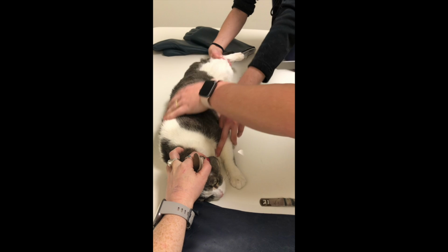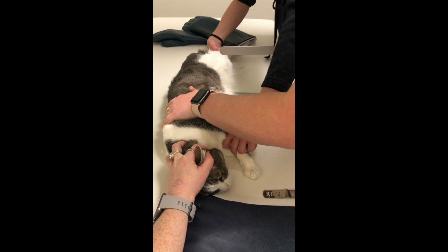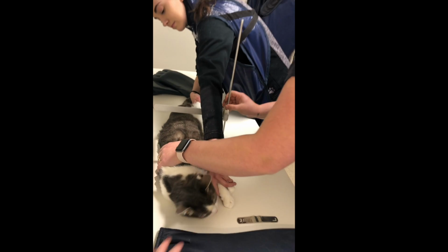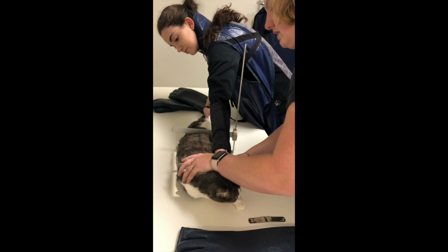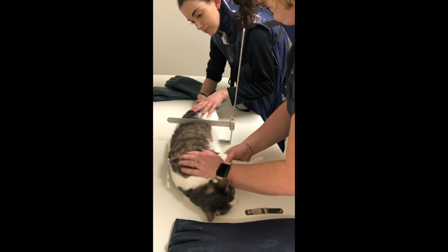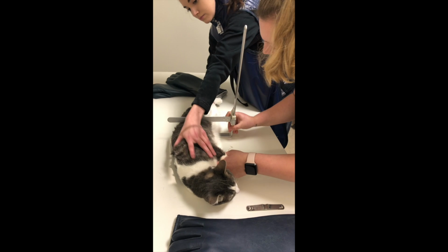This will give you the best measurements for evaluating the specific structures needed. Patient preparation varies depending upon the special procedure being performed, but in a GI tract study, the patient should be fasted, hair coat should be clean, and the correct amount of contrast medium should be given.